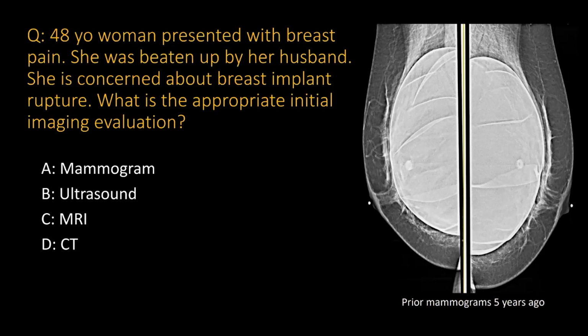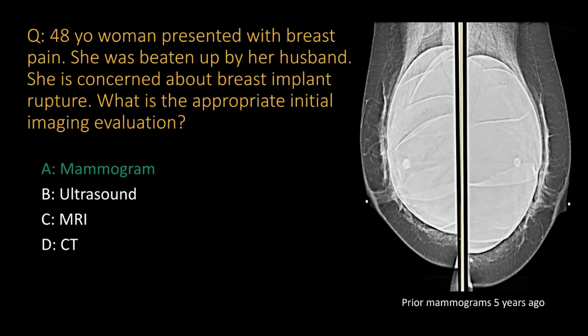All right, let's look at it together. The correct answer is actually mammogram, because based on the imaging, you know that the patient has a saline implant, right? Mammogram is very good to detect saline implant rupture.